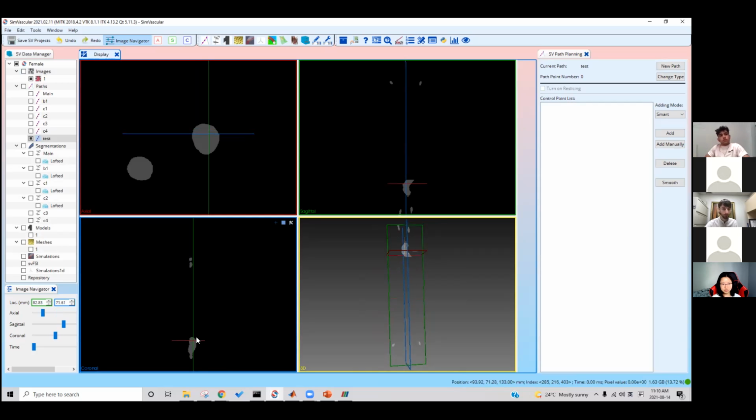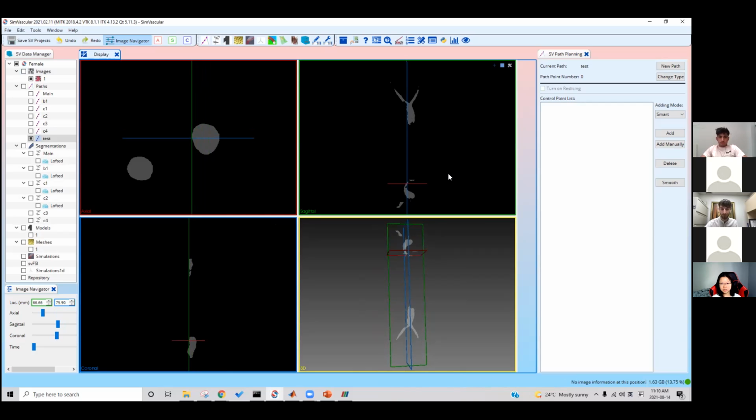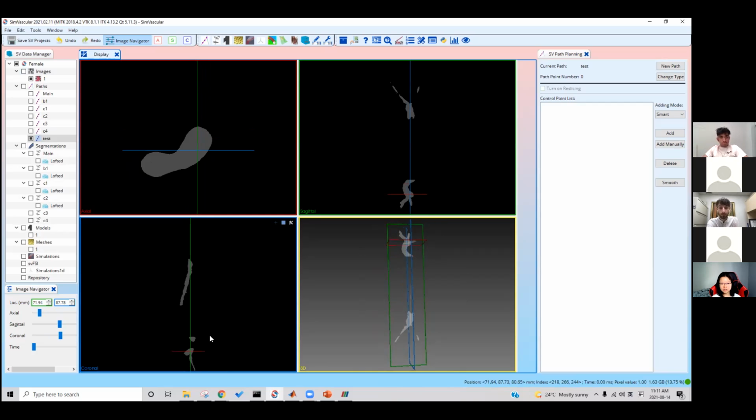So obviously here, this view is pretty good. I can see kind of the aorta going from here all the way to here. So note that it is backward. I'm not sure why it imports backward, but this can be easily fixed by just reversing the VTK. So I'm gonna try to see if I can find the start of the main aorta.